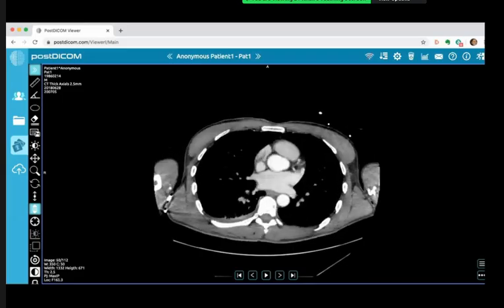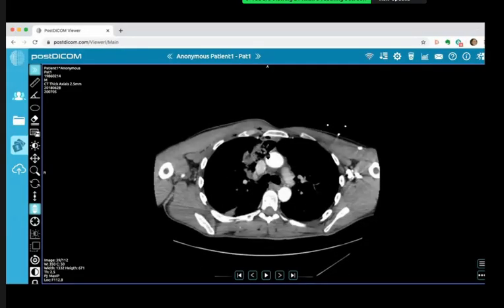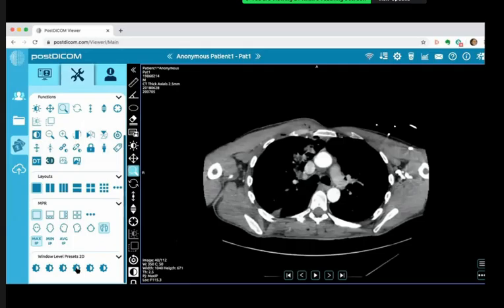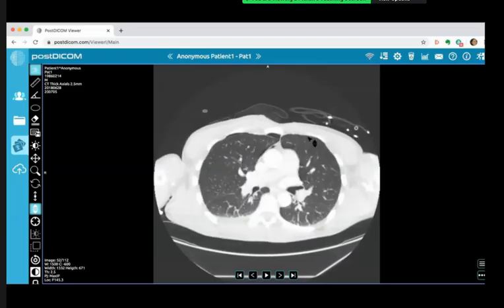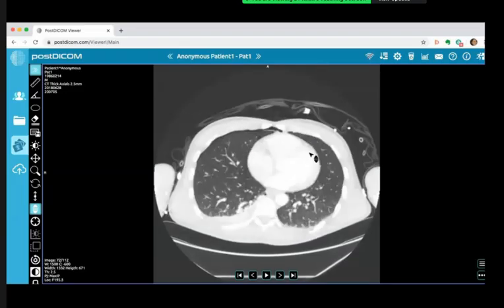And I think I saw some likely pulmonary hemorrhage within the lung as well. And there's an associated hemothorax inferiorly and a small anterior pneumothorax as well. I'd be concerned about injuries to either the large vessels, specifically the aortic arch, and the heart itself.